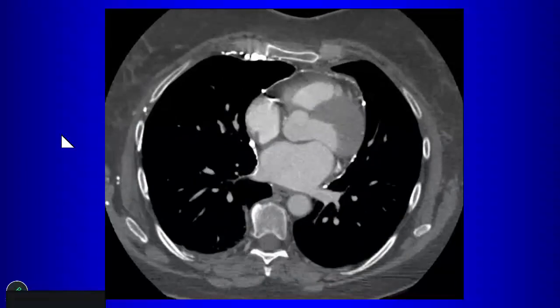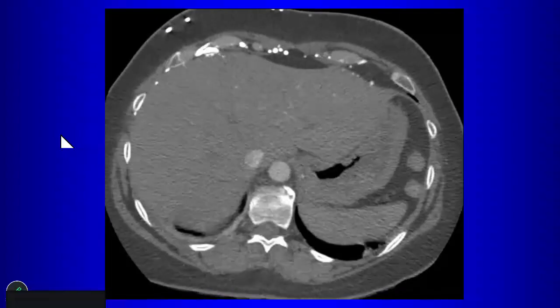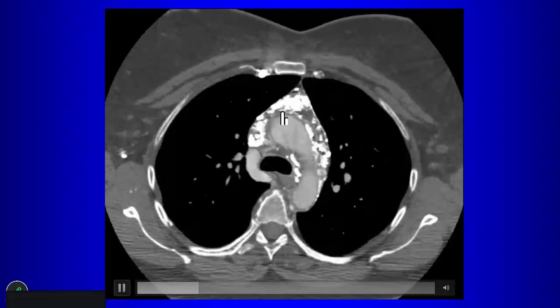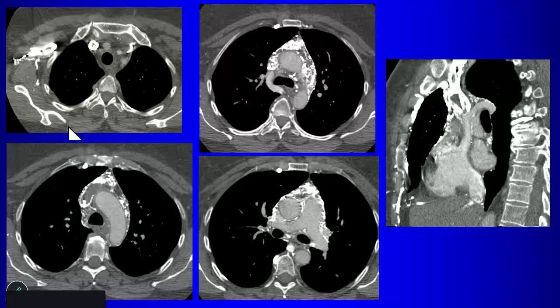And in this particular case, we can see that there's that big thrombus along the left brachiocephalic vein extending into the superior vena cava. So as we follow it, see there's that thrombus there around the catheter going into the SVC. Okay, and so you'll have collateral routes. The azygos vein is a very important collateral route when you have SVC obstruction.